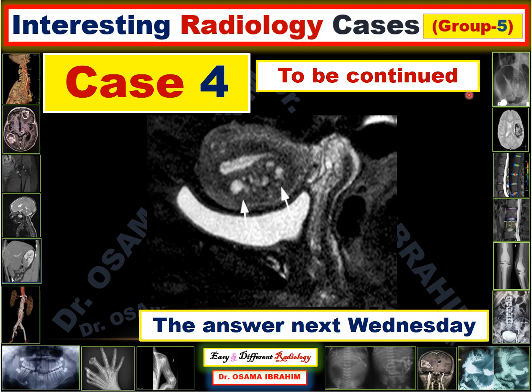Case 4 is to be continued next Wednesday. I am only putting up the image. This is an MRI image, and this is the urinary bladder, and this is the uterus. And I will give the answer in next Wednesday's presentation.